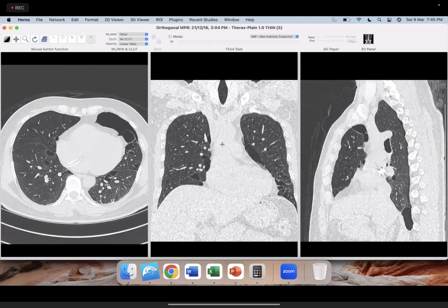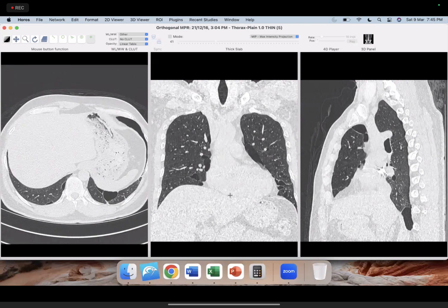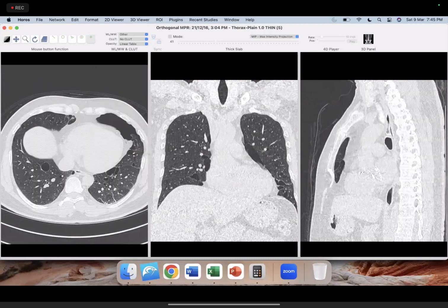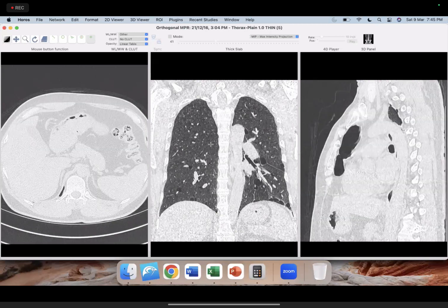So again, the patient can be male or female, but typically this type of morphologically heterogeneous cyst with different shapes and even septation many times, like in this example you see in the left lower lobe, then you start thinking of Birt-Hogg-Dubé or BHD syndrome. Typically, they will show this perivascular and subpleural distribution with lower lobe predominance. And in these cases, always pay attention to the kidneys also, whatever you have covered, because these patients are also at a high risk for associated renal malignancy.